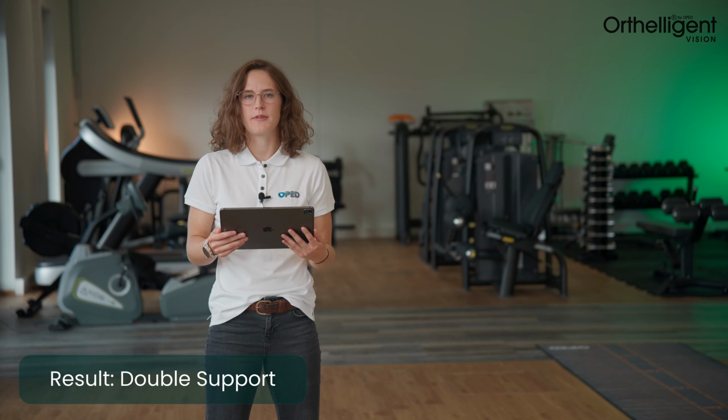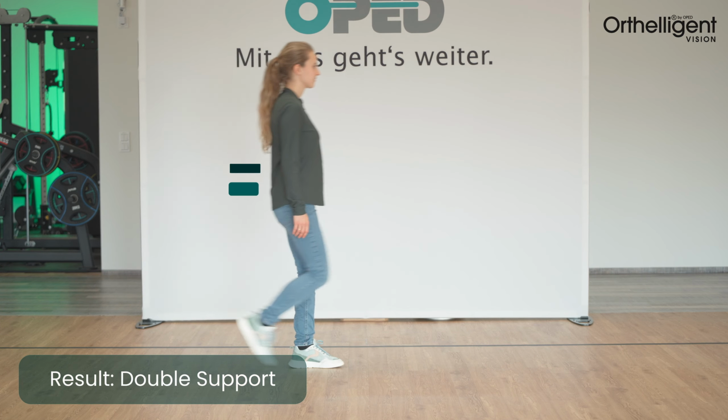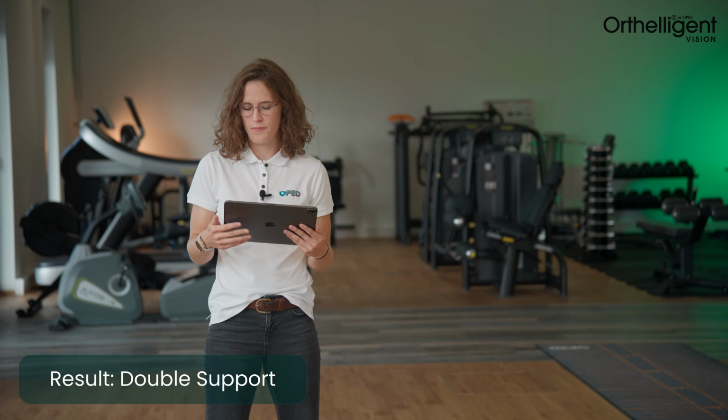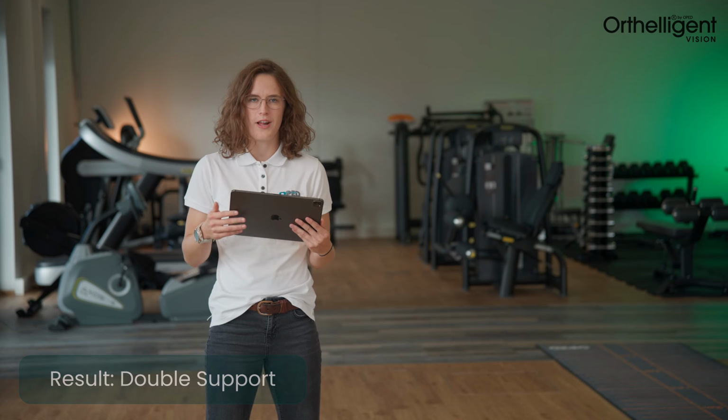The parameter double support shows the proportion of the gait cycle where both feet touch the ground. Somebody who's very unstable while walking has a very high value. Somebody who's very confident in walking has a very low value.